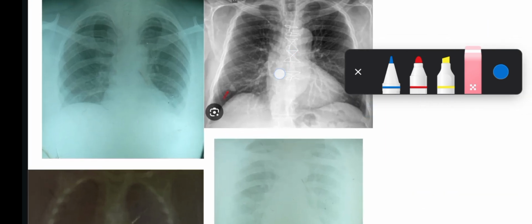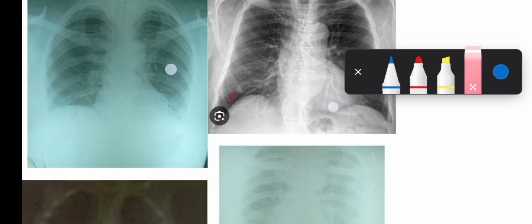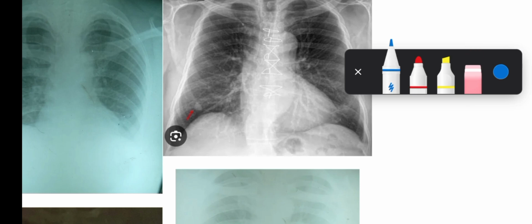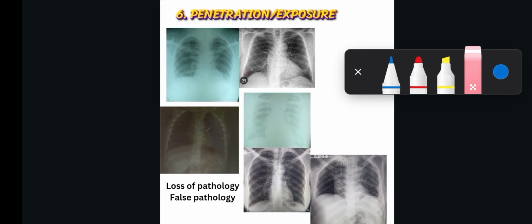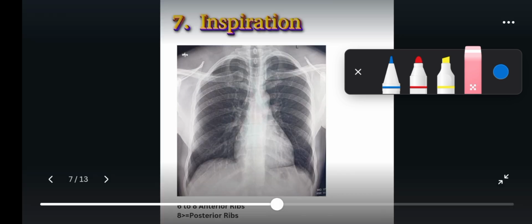Then I want to show you this particular X-ray, so you know the danger of a poor X-ray. In this X-ray, you can see this tiny structure there. That is a nodule. In this particular X-ray the exposure is okay, but if it is overexposed, we may lose this nodule and may not be able to see it. It may blend with the other structures, these dark areas, and that will make us miss an important nodule. And this nodule could stand for lung cancer. So you can see the consequence of missing a tiny structure in analyzing an X-ray.